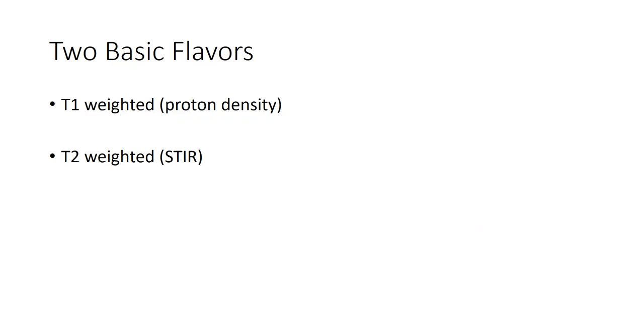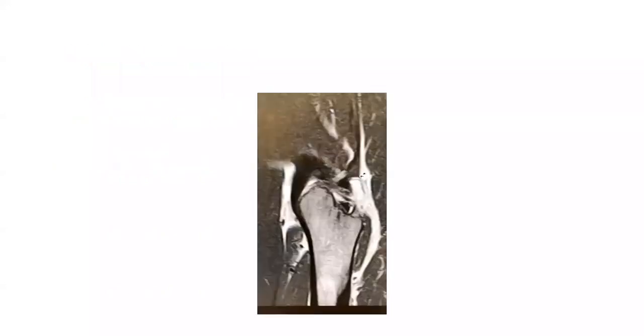And then the T2 or stir weighted images, these are more weighted towards the liquid component and processes in which there is inflammation going on, okay? We talked about inflammation, right? Okay, what are the cardinal things of inflammation? Rubor, calor, dolor, functio laesa, right? Okay, when we're not talking about Latin, it's inflammation, right? What do you get? You get leaky capillaries, you get fluid going into a space, okay? So a tumor is gonna have edema, a fracture is gonna have a lot of edema. Blood will look bright on it, but blood may layer out because blood has a lipid component, all right? And it's got a liquid component. So sometimes the layering in an MRI can be instructive.